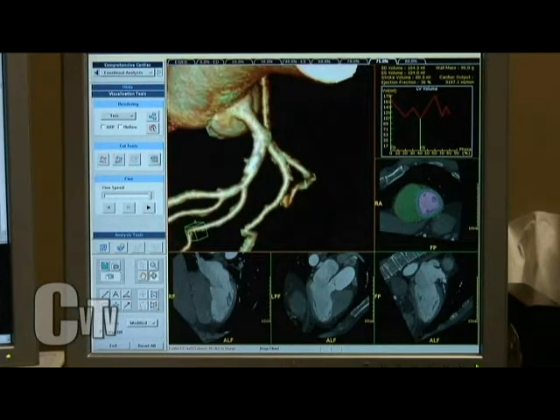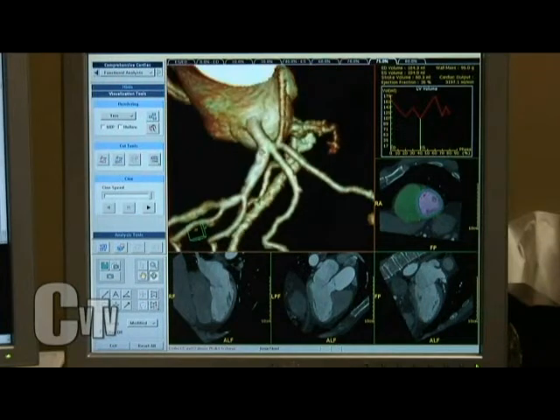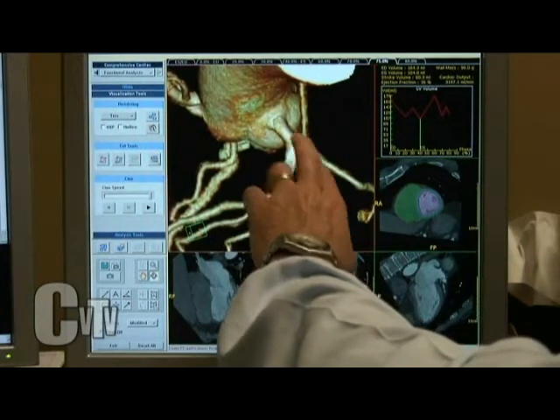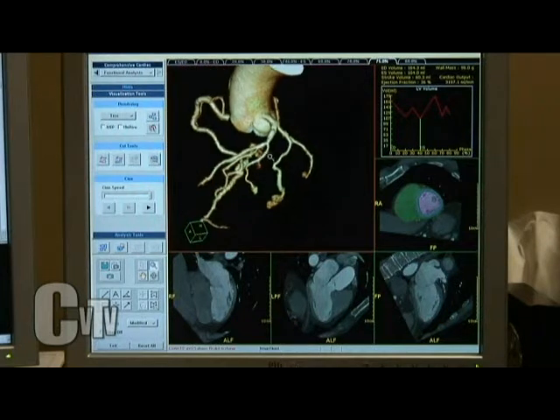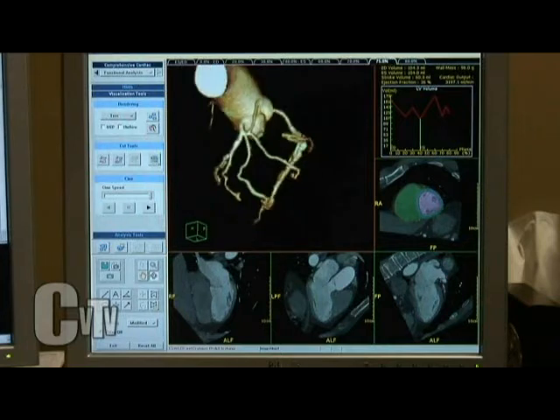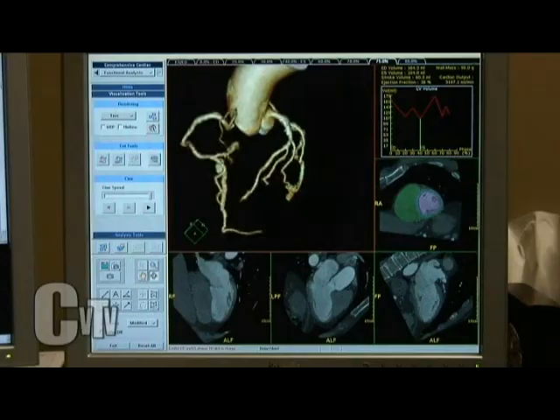Wow. This is a long time. Hopefully, I think we got it just in time, but had that plaque begun to grow any further into the blood vessel, that's when he could have had a heart attack. And if it broke open right here and a blood clot formed, that's just all she wrote. Right. You're going to lose all of this. See how much of that heart that blood vessel there supplies. That's a big heart attack, and could even be a fatal heart attack.